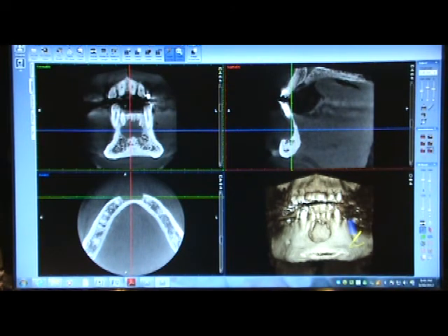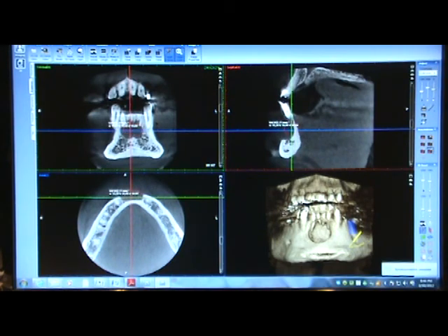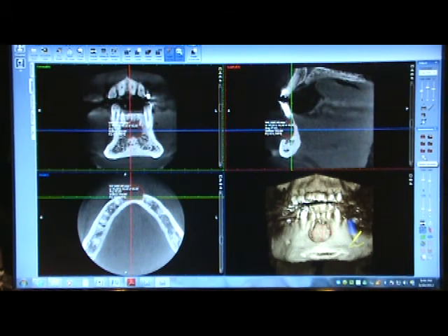Top left here, that allows us to get an idea of how big an area is, and it gives us the actual dimensions and area within the circle. So there's a lot to the software. The software has a lot of detail and a lot of tools to help you manipulate a patient.